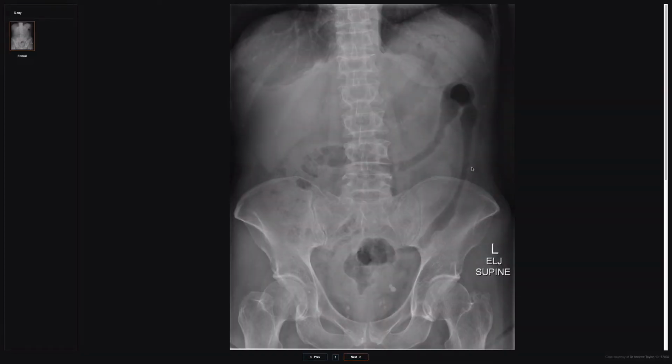In this case, we have superimposed colonic wall edema, but also what's known as the lead pipe colon sign, which indicates that now this colon has undergone many cycles of inflammation and has begun to lose its haustral fold pattern and it's effectively become burnt out colitis.